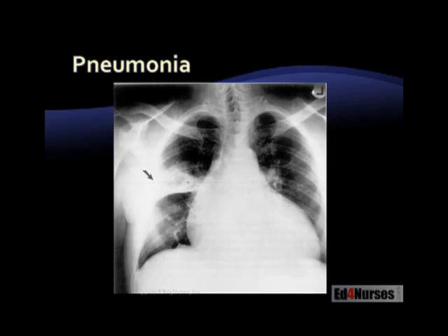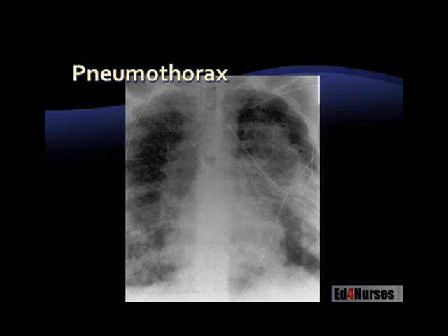Assess the pleura. Pretty dark up there toward the top, but basically pretty clear, except for this thing we've got going on here on the right lung, which is on the left side of your screen. And this thing is very well encapsulated. Look how nice those margins are on that thing. And it's very bright white. So this is a very thick infiltrate. This patient here has pneumonia. Look at that, how enormous that heart is. That heart is just huge in this patient. Can't really see the abdomen going on in this particular x-ray.